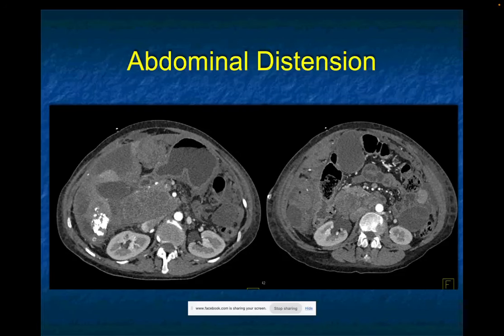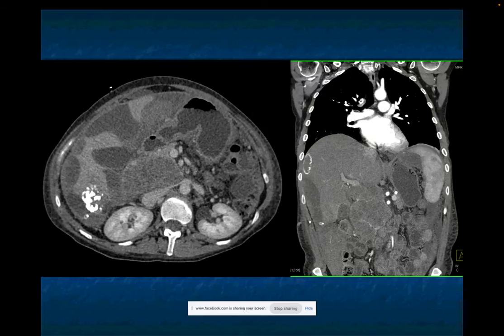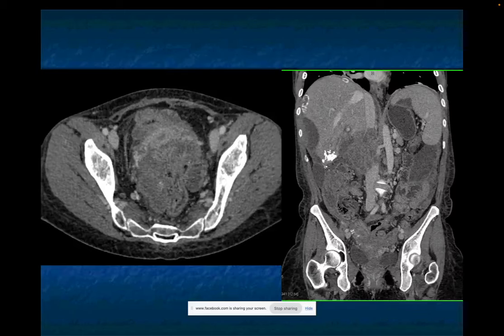Abdominal distension, and yes, when you look, you see implants on the omentum, the mesentery, on the stomach, and throughout the retroperitoneum. First thing you're going to end up saying with scalloping lesions is carcinomatosis, pseudomyxoma peritonei. Could it be from appendix, from ovary, from stomach, from bile duct or pancreas or anything else, colon? Well, that's a good thought. You can see some of the lesions are calcified, which pushes you to mucinous. Again, I would be thinking ovary with the right history, but the patient had no history and there's a mass in the pelvis. Maybe it's just ovarian cancer with carcinomatosis.